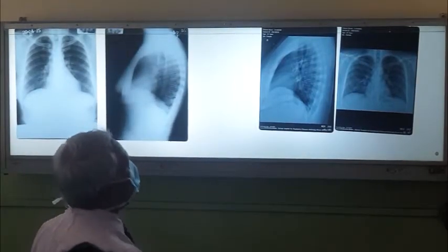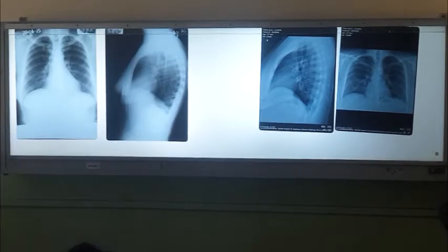Right, these are normal looking X-rays in here, right? So, although we call them X-rays, these are radiographs, right? X-ray means X-ray beam, and so we normally call it chest X-ray. And chest X-rays, all the doctors should be able to read chest X-rays, right? Because in the OPD, when you post as an intern, you are supposed to sign for medicals. At least you should be able to say whether it is normal or abnormal. You have to say, right? So you are supposed to sign for medicals. So any doctor should be able to read chest X-rays.